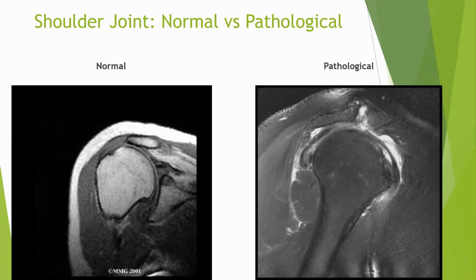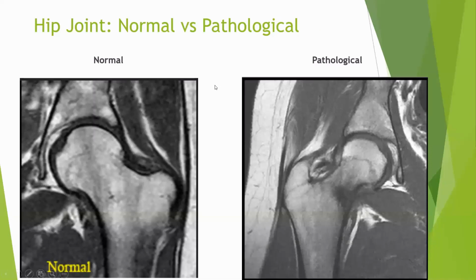Again, normal or pathological. Now, you will not come across this; probably surgeons will take a look. Normal, as you can see, everything looks okay. Here, look at this darker area. This is basically a neck of femur fracture. So probably the surgeon wanted, before surgery, to better analyze the soft tissue relation, the adductor muscle relationship to the fracture site, to understand the technicalities of surgery.